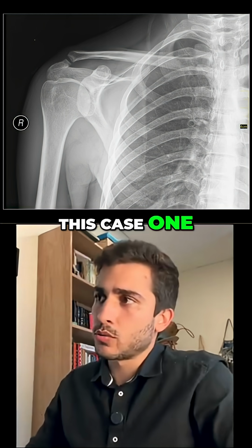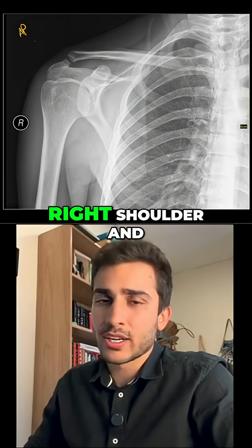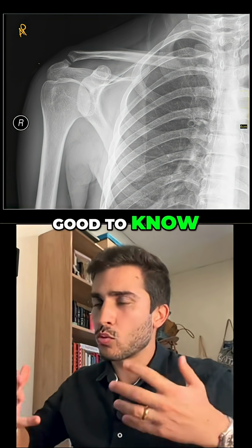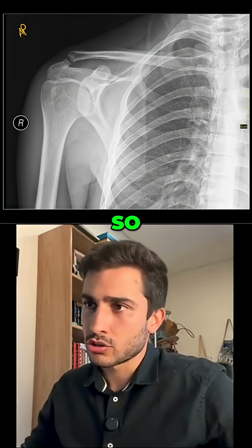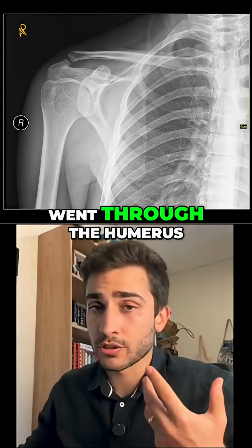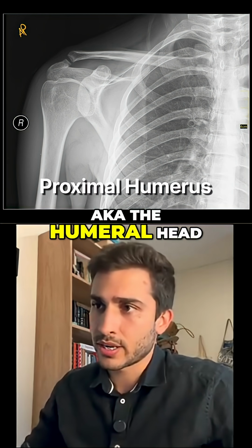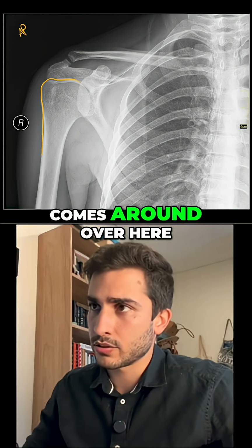Okay, so in this case one, we have an AP right shoulder. And just before we get started into the critique, it's good to know what anatomy you're looking at. From the previous video where we went through the humerus, this is the proximal humerus, aka the humeral head. So the humeral head comes around over here.